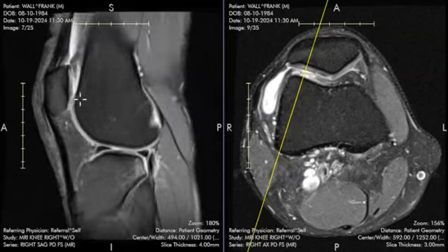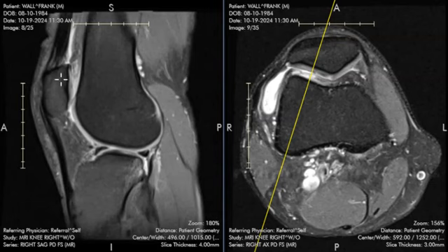Next, I noticed that you have a variant of anatomy within your knee unrelated to your recent injury. It's called patella alta. It means that the kneecap is higher in position than it typically is in the majority of the population. People with a patella alta are more likely to result in fat pad impingement like this, and they also have a mild predisposition to dislocating their patella.